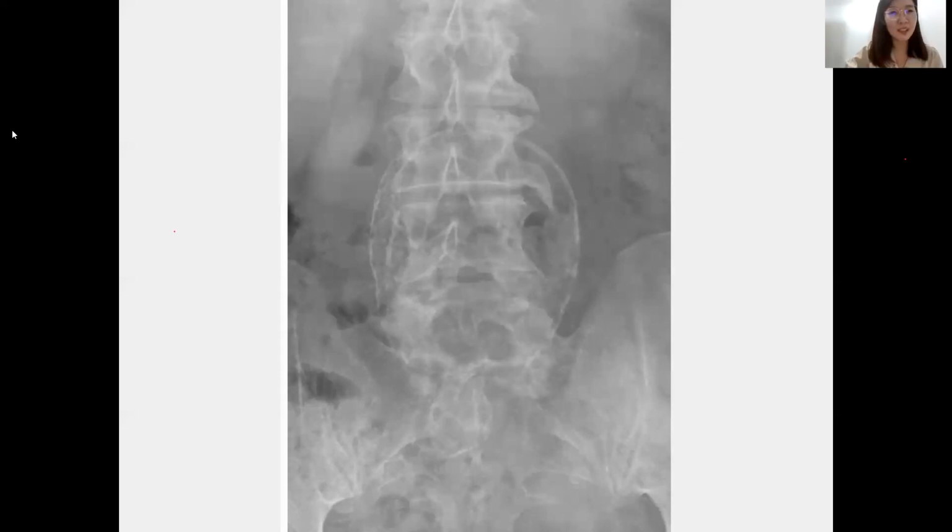We'll try spinal abscess. Okay, spine abscess. No, spine abscess won't show as this calcification. It will always show small opacity at the side. Bladder mass? Bladder is further down. This is above the pelvis already. Okay, this is above the pelvis. Yes, A, correct. Sabrina is correct.